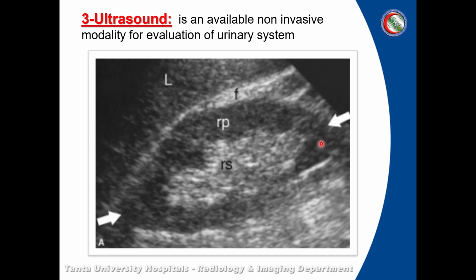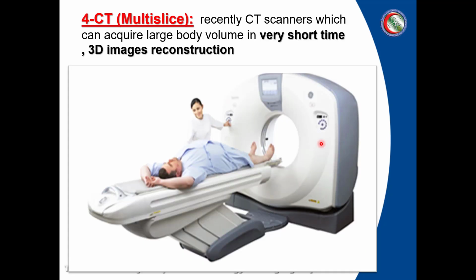Ultrasound is important as it assesses the renal parenchymal thickness, important for assessment of any stones and any abnormal hydronephrotic changes. Any cysts or masses may appear very clear in ultrasound. So it's a very important modality in urinary system assessment.